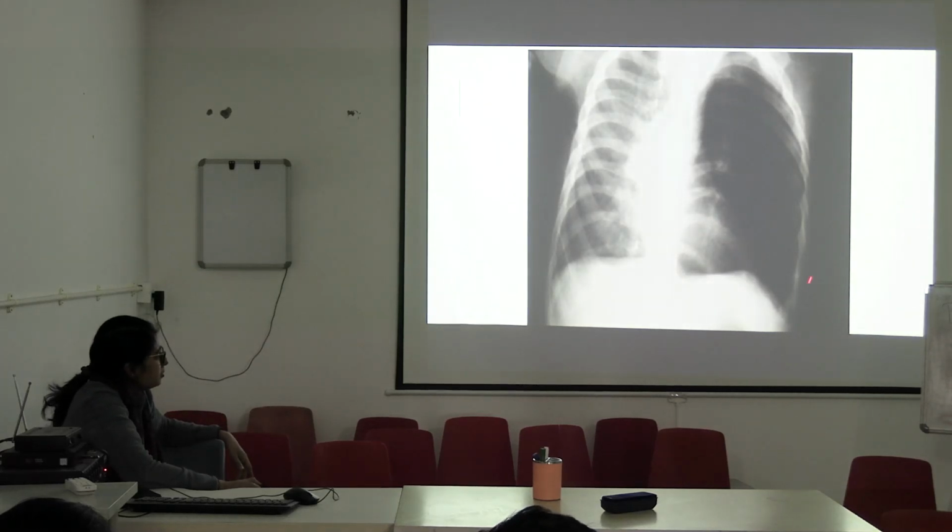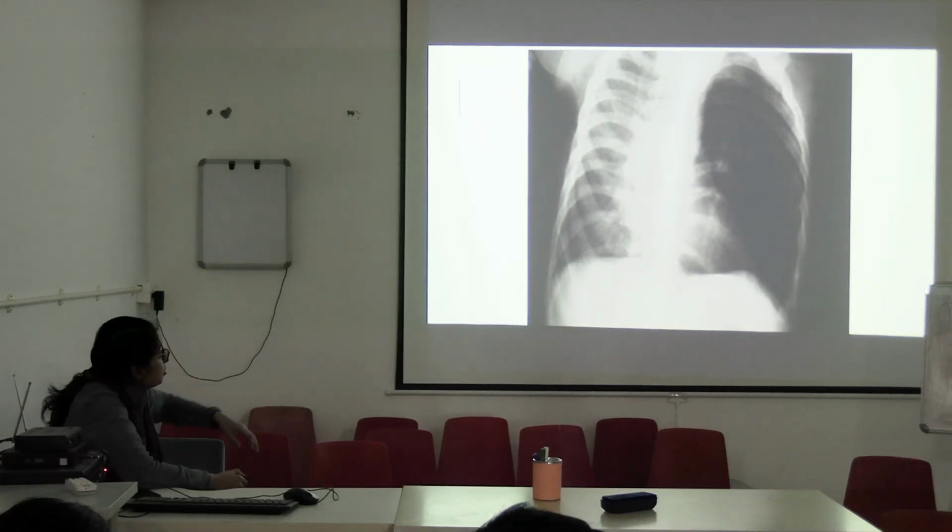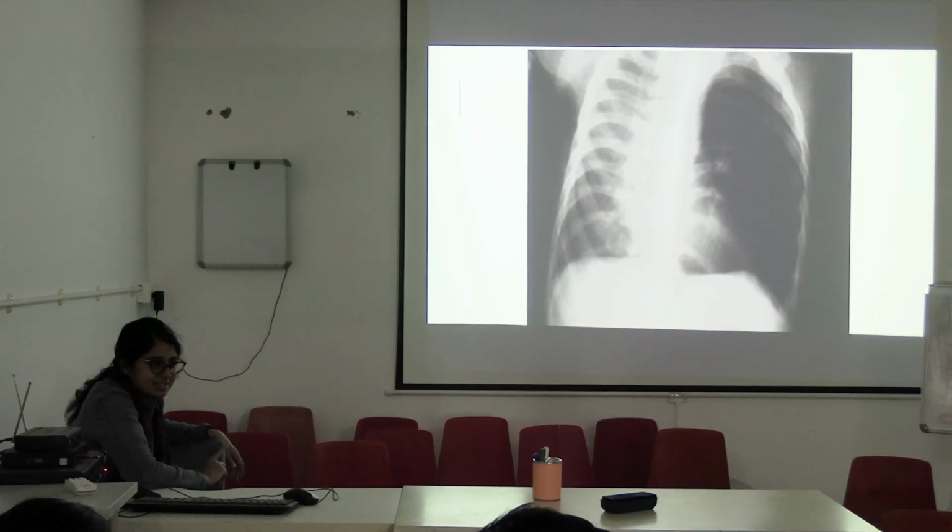এই যে এতটা বড় লাং কতটা শিফট করেছে দেখো, হার্টটা তো পুরো ওই দিকেই চলে গেছে, রোটেট করে গেছে। The lung is totally rotated. Okay, I want someone to describe it. It's a bit difficult x-ray, কারণ এটা মনে হতে পারে যে লেফট দিকটা রাইট দিকটা পুরোটা কোলাপস করে গেছে. Even in the examination hall you call it pneumothorax, or pneumothorax plus collapse of right lung, you will get some marks. It's a little bit difficult x-ray.